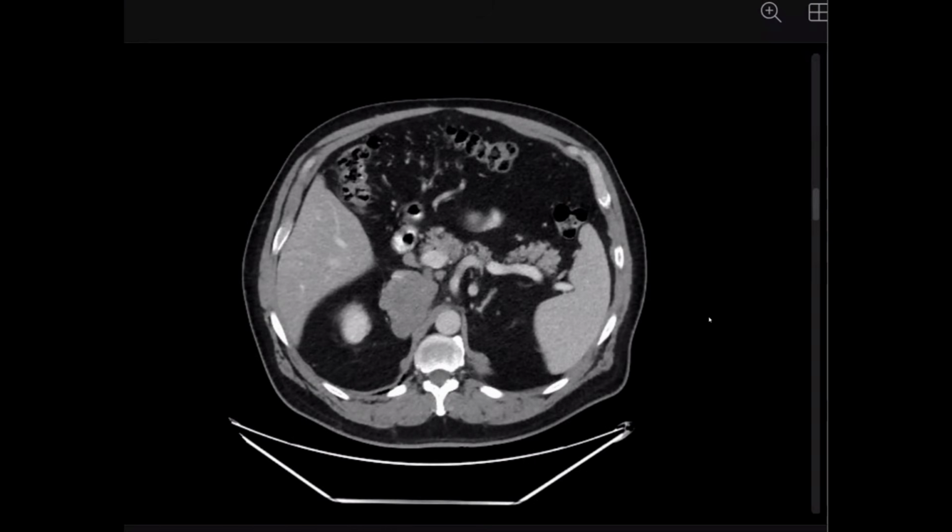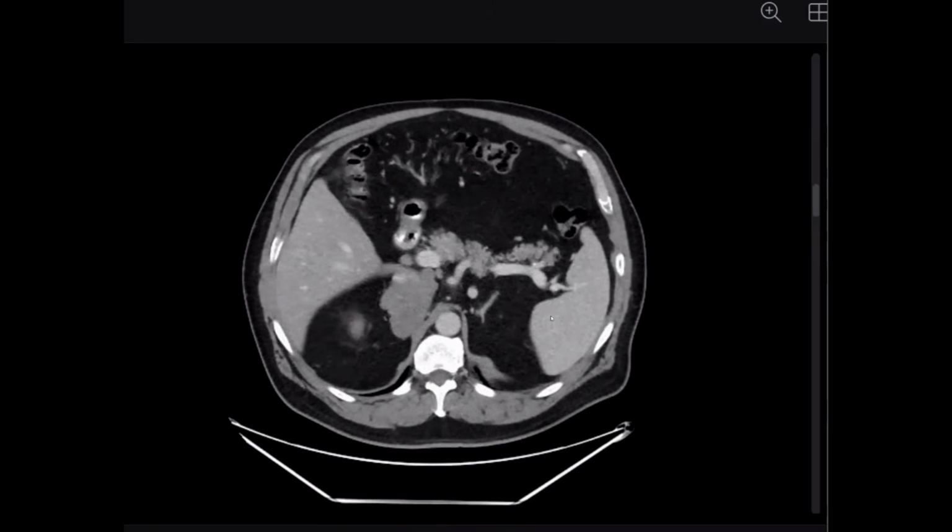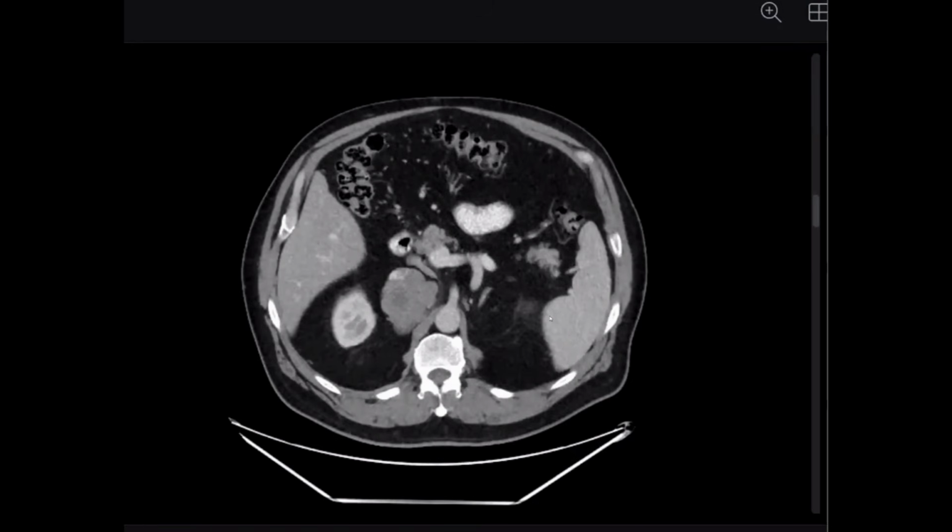As you said, you are perfect. We have a malignant retroperitoneal mass, invading the IVC or arising from the IVC and going into the retroperitoneal space. This case was proved to be IVC leiomyosarcoma. So we have three types of retroperitoneal sarcomas: liposarcoma, leiomyosarcoma, and undifferentiated pleomorphic sarcoma, or malignant fibrous histiocytoma. This is the same name. If you have any retroperitoneal mass arising from any major vascular structure, for example from the IVC, you should search for leiomyosarcoma. Okay?